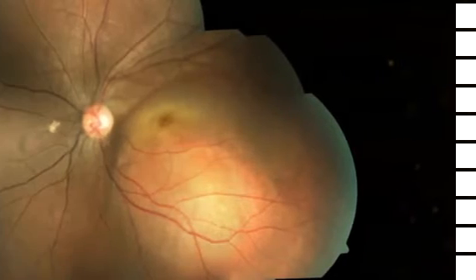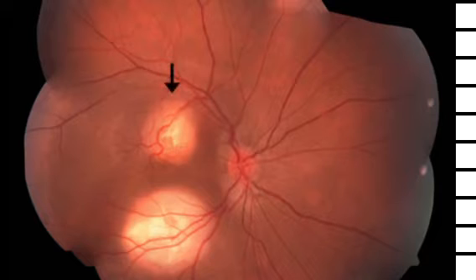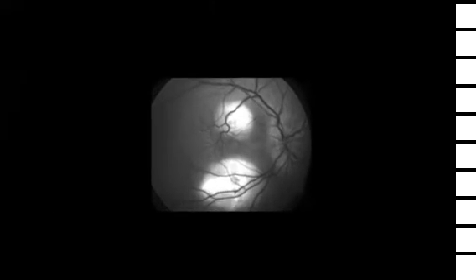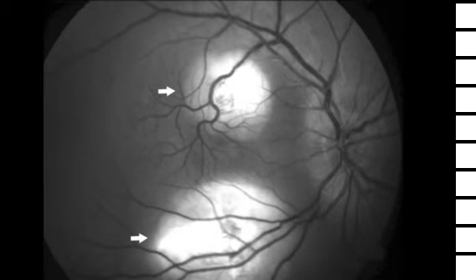Choroidal granuloma presents as an intense or a dull yellow, elevated choroidal lesion with or without a surrounding subretinal fluid and may be single or multiple, with an associated vitritis. Ultrasonography demonstrates the presence of a dome-shaped mass with medium to high internal reflectivity, with an angiogram demonstrating a hyperfluorescence in all the phases, pointing towards the etiology of the lesion.